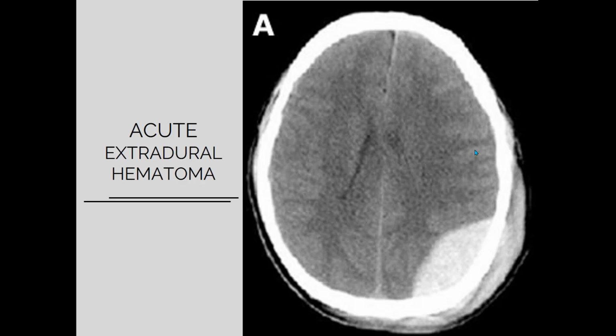Other thing is that sometimes there are associated findings as well. In this case you can see that there is some edema of the soft tissue. You can also write this down, but remember that you must write down the main findings first. Okay, and if you can see a midline shift, you may write it down, but if you are not sure, please avoid it, because then there may be deduction of marks, because actually you cannot measure the midline in these pictures.